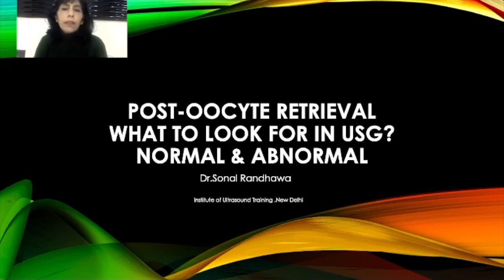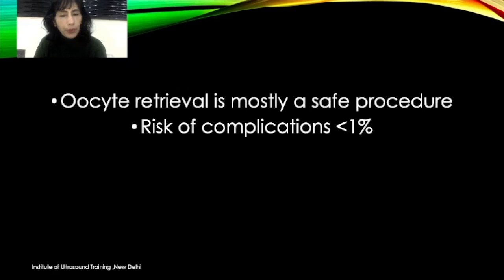Hi everyone. Today's topic is a small one. It's more of use for those people who are working with infertility specialists, or who are infertility specialists doing ultrasound by themselves. There are a few things which you should be aware of after oocyte retrieval has been done. Oocyte retrieval is a very safe procedure.